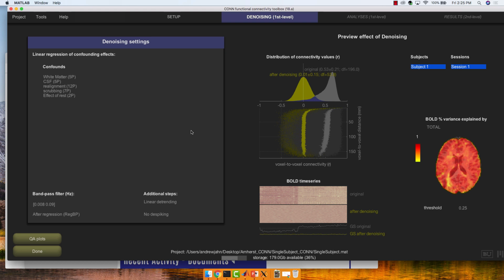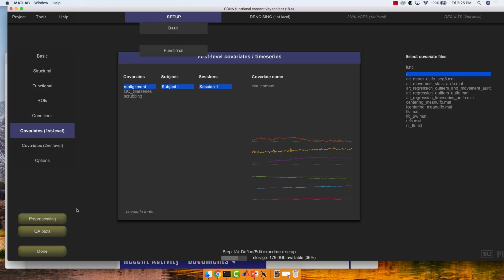So I did miss how you launched this phase here. Oh, I just clicked on in setup. Yeah, I can go back and forth between these. On setup, I just clicked done. On the lower left. Yeah. So it'll take you a few minutes, but I'll go on.